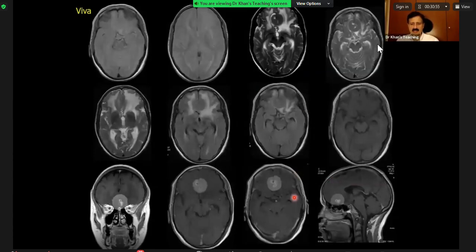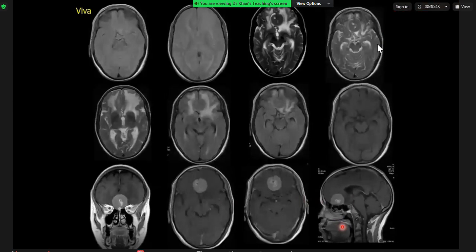This is a very good exam case. What do you think is happening? And these are the post-contrast images. If you can concentrate here and tell me your diagnosis. Yep, so this is a central lesion epicentered on the parasellar region and at the skull base with enhancement. It's fairly well circumscribed and appears to be extra-axial. So I think this is likely to be a meningioma.